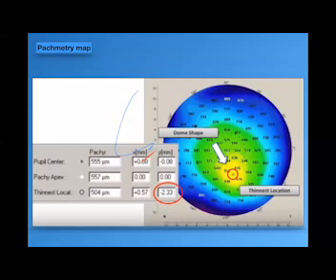As we said here, correlate the apex of the cornea to the thinnest location and the difference between them. You have to correlate on the back of the cornea the thickness in the superior and inferior points, which shouldn't exceed the accepted range, from 30 to 35 micrometer. If you find a thinning in the inferior cornea, which is far away from the superior part of the cornea, you have to suspect, even if it's still in the normal range.